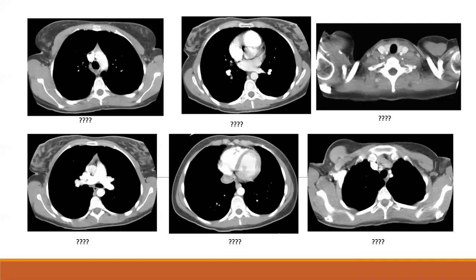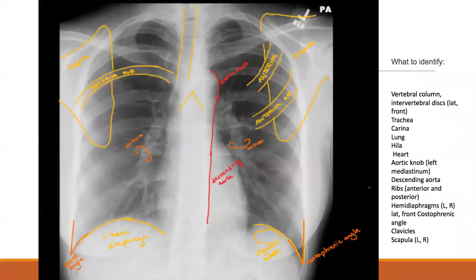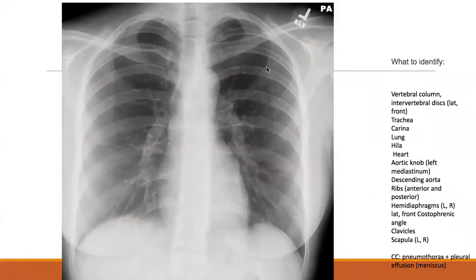Oh, sure. So I am not 100% sure if you guys cover both types of scapular winging this early on. I think you for sure cover the medial scapular winging. Let me go back to that scan real quick. Okay, so here's your scapula. If it deviates medially, remember this is the middle, this is lateral, right?